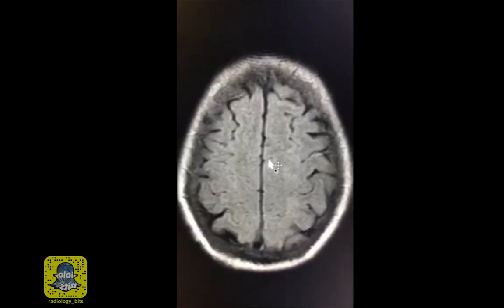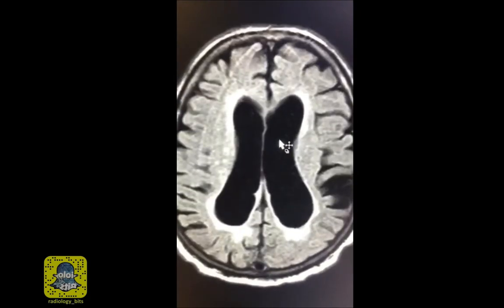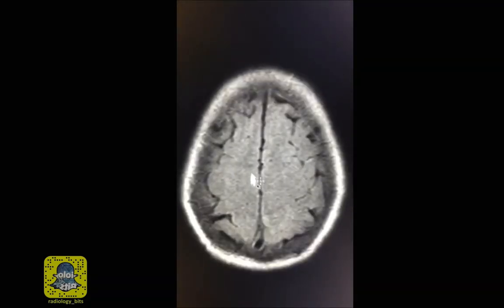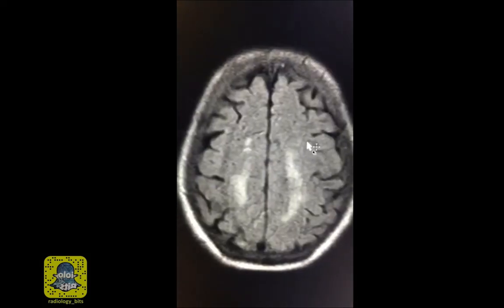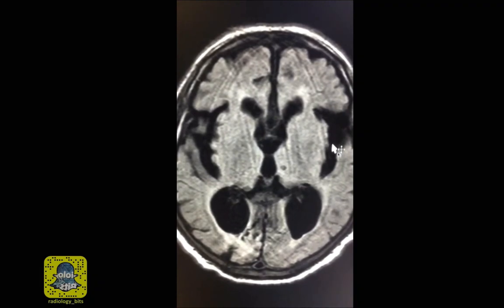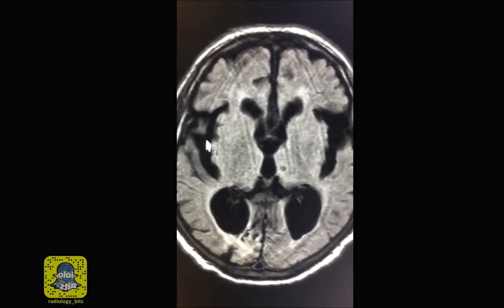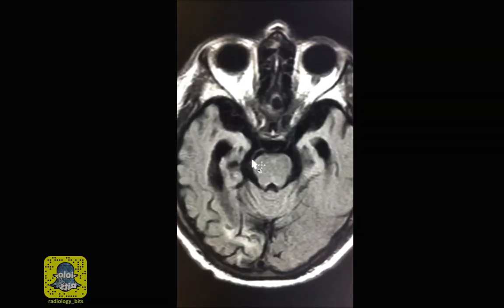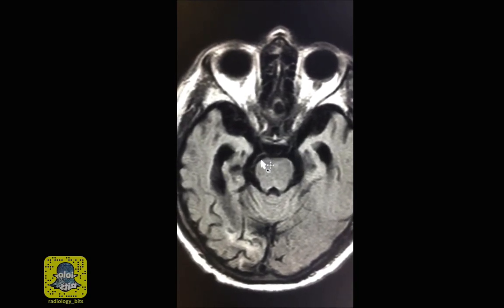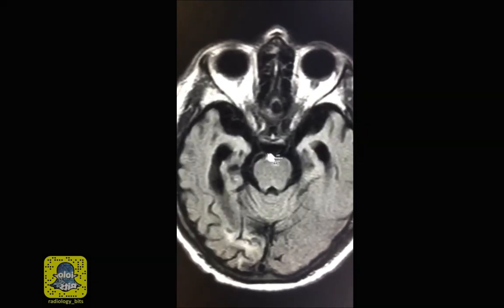And this is a sign that makes sense, since the dilated lateral ventricle pushes everything upwards and leads to this fullness here. And as it does that, it lifts the brain upwards and gives you a more dilated appearance of the sylvian fissures here, as well as a more pronounced appearance of the basal cisterns or the cisterns surrounding the brainstem.